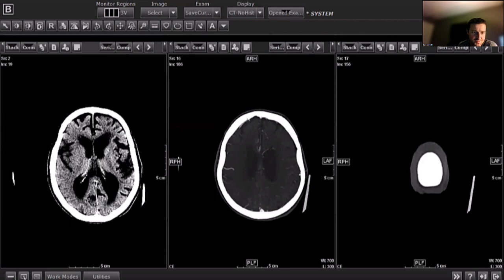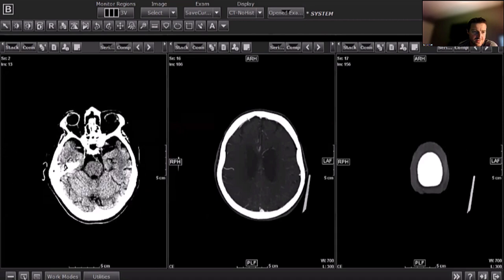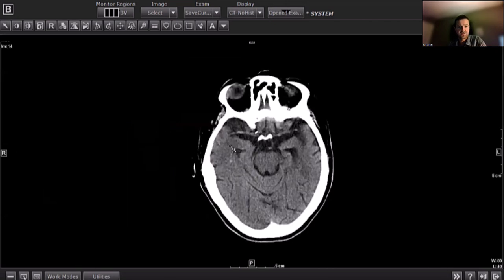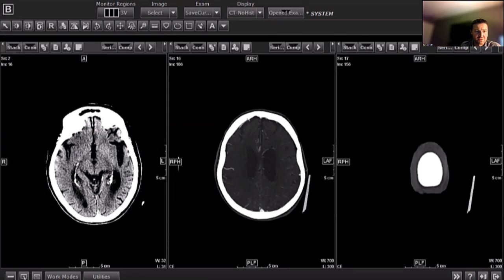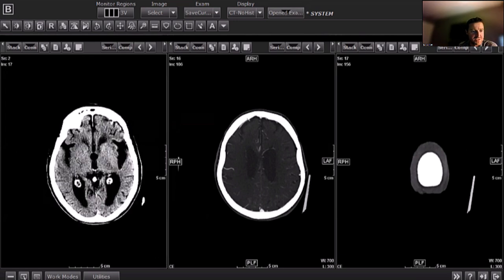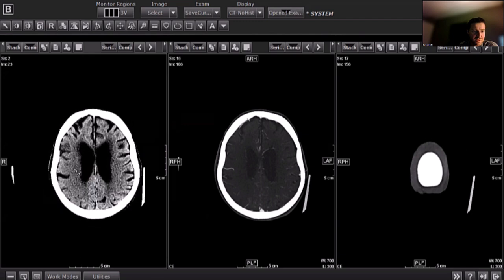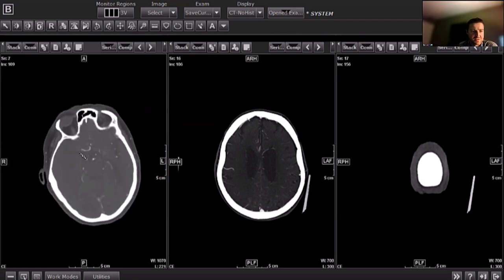So another patient, this guy's presenting with left-sided weakness. It's a little bit tough to see, but looks like there's a slightly hyperdense M1 distally. And then on our stroke windows, we can see that there's a large area of evolving ischemia. We've lost our insula, starting to smudge the caudate and lentiform, and then a large portion of the M1 through M6 as well is affected. And we can see we've got a distal M1 clot.